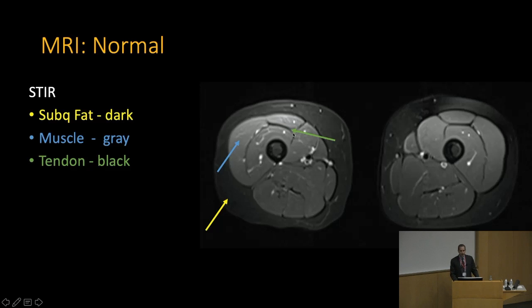This is a tendon. And fascia, if it's normal, is often invisible. We don't even detect it. So when I show cases of fasciitis later, you'll see what that is. And in the center, obviously, is the femur, and the black is the cortex of the bone, and the center is the bone marrow space.